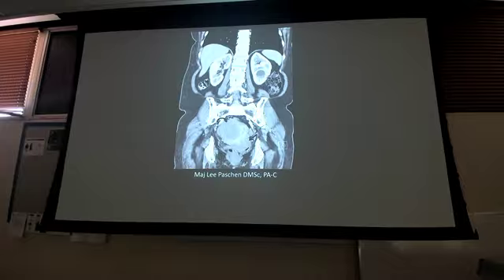What we have here, does anybody know what the black arrows are showing? Stuff, right? So this is a female patient, and you're not going to know just from the picture, okay? This is actually a uterine fibroid that's sitting right here. So it's a fibroid on the uterus. You'll learn more about that in Women's Health again. I say that a lot, but you will. So this here, where this arrow is showing, is the main uterus. This area here. This is the fibroid.